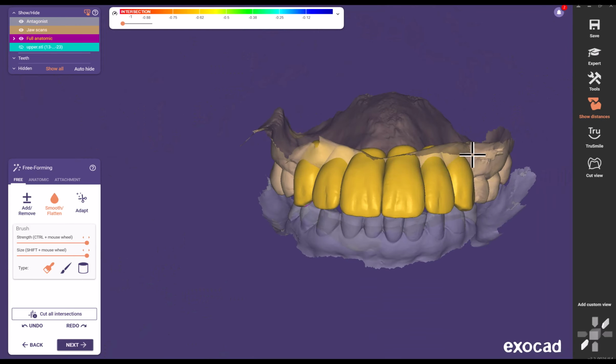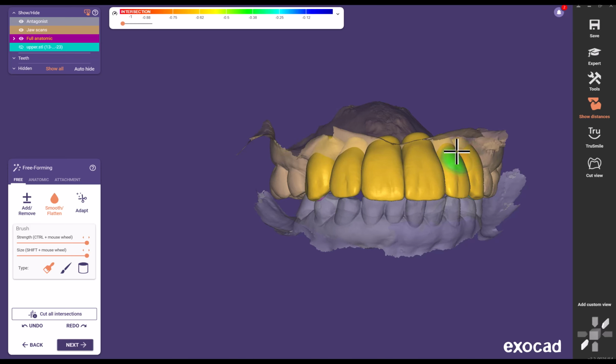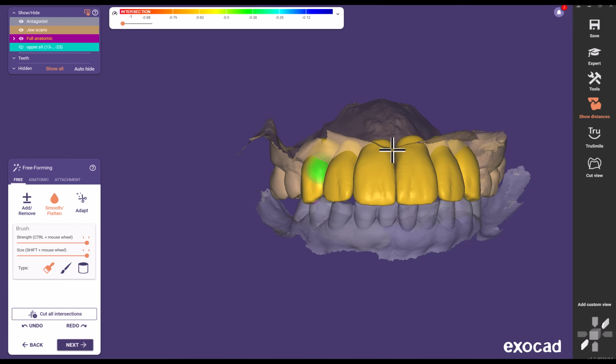Alright, so I need to know about lip line and stuff to even know what to do up here with these gingival levels. I can make big long banana teeth if they don't have any high smile line at all. Like if it's never going to show, we can do that. It'll be an aesthetic compromise if they raise their lip.